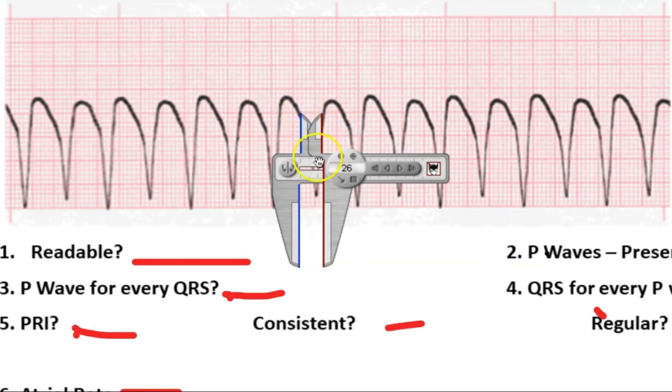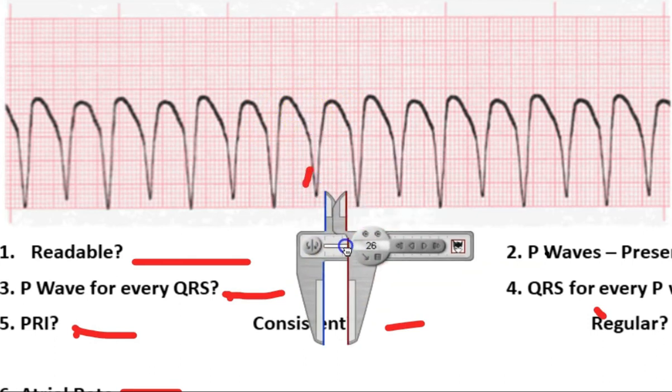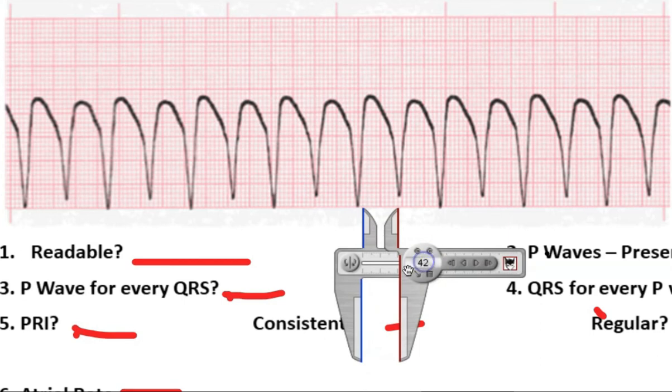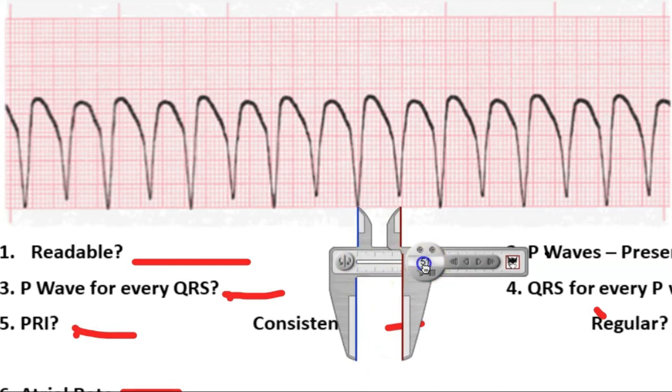Now I'm going to move up here and take a look at my ventricular rate. Probably could have done this earlier.